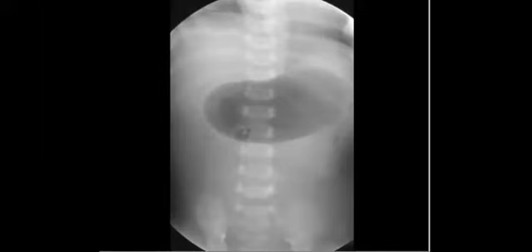If it is a single bubble with distal gas, then now you should add another differential, especially if you suspect a high intestinal obstruction. What makes this appearance happen? Imagine that the intestine in this area has malrotation or malfixation, and then volvulus. Perfect. So search for any faint lucency. If you find it, the differential will be an emergency. It will not be just atresia, it will be an emergency.